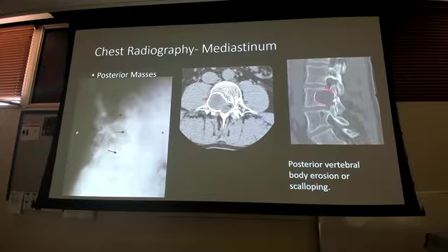On x-ray, on this far right one here, you're not going to notice that vertebral body kind of missing because although it's been eaten away, there's a mass and a tumor sitting behind it. So radiation just gave it shadows, right? There's still something there. So you wouldn't notice on x-ray that it's being eaten away. You would notice the increased radio opaqueness because that's a lot thicker than what it should be when you put in the soft tissue and the bone. So you may end up noticing that primarily on the lateral or even the AP, and then you get the CT and then you see it.